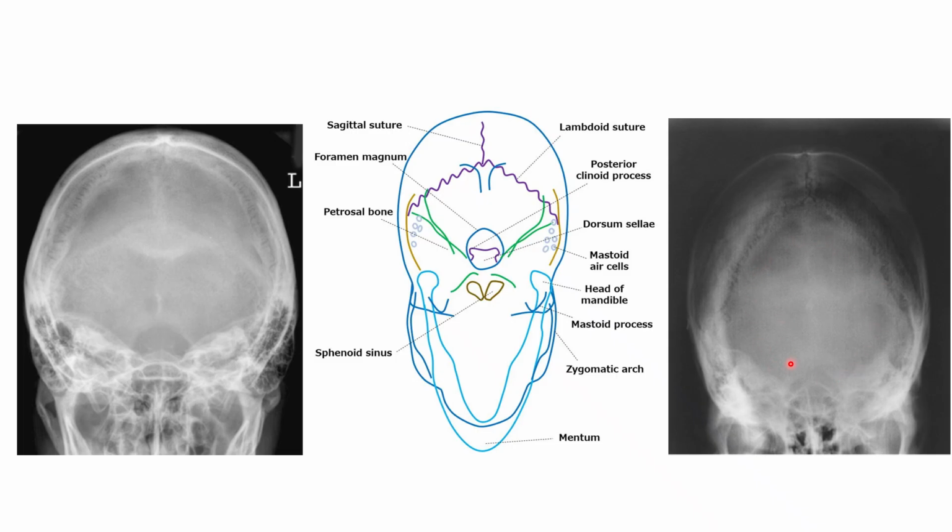So are we showing what we need on this image? Absolutely. We've got the occipital bone centered on the image. Beautiful. The technique is beautiful. The parietals are not burnt out. It's just a very, very nice image.